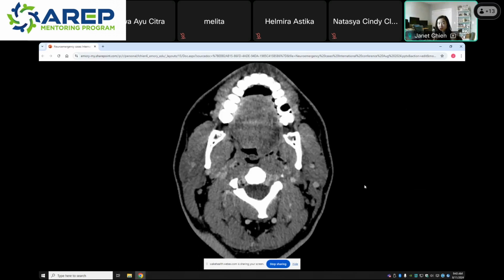What do y'all see here? Dysphagia and hoarseness. Anybody see anything? What's going on here?